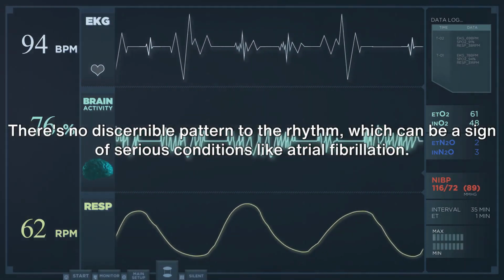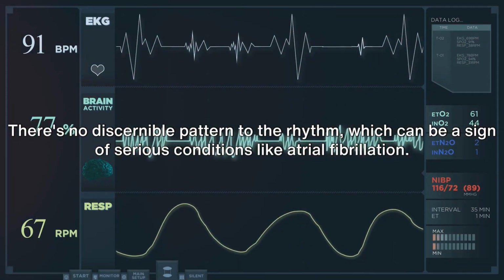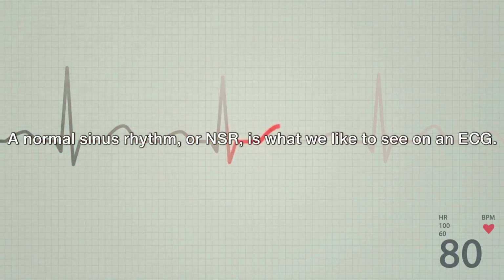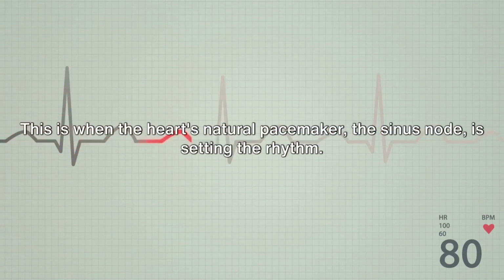There's no discernible pattern to the rhythm, which can be a sign of serious conditions like atrial fibrillation. A normal sinus rhythm, or NSR, is what we like to see on an ECG. This is when the heart's natural pacemaker, the sinus node, is setting the rhythm.